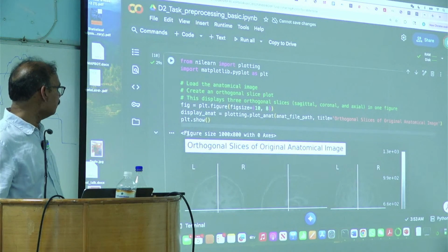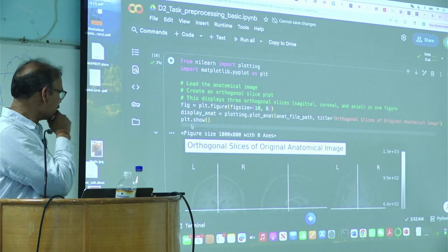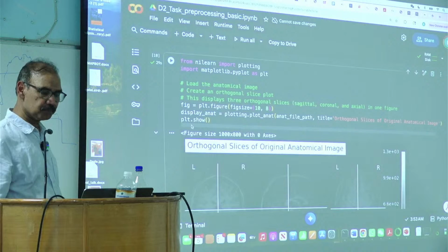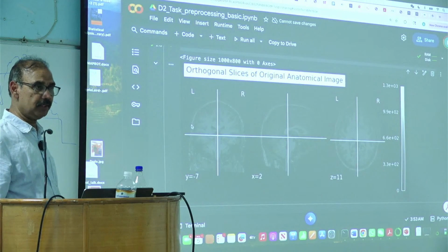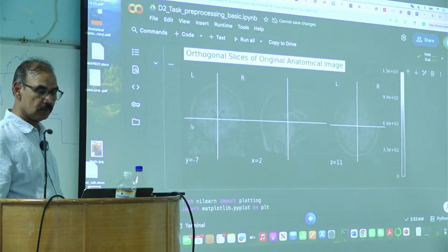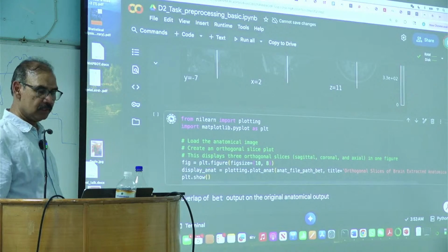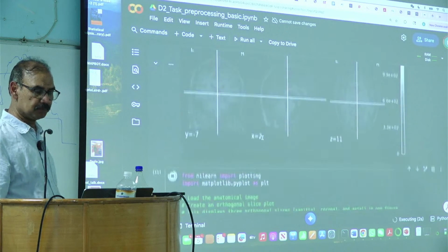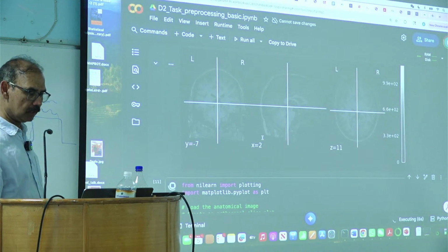So you can, again, try to be up to date so we can look at specific things, right? So this is just displaying the anatomical, right? Without doing any segmentation, which would remove everything outside the brain, including the skull.